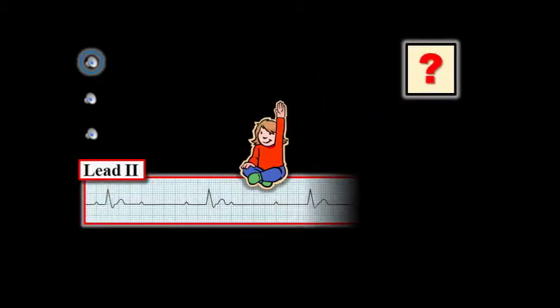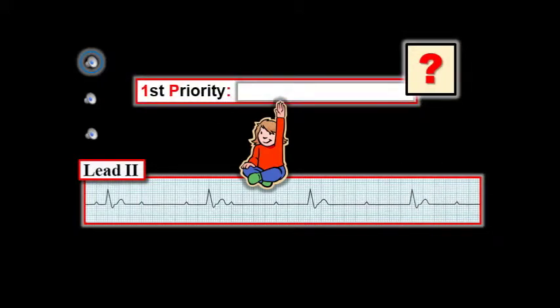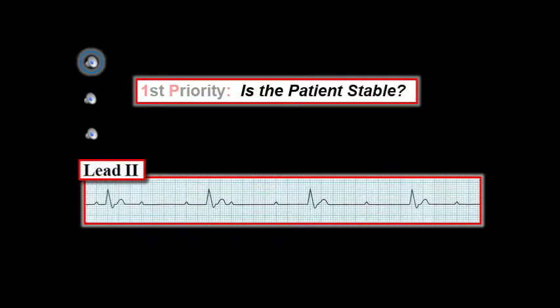So, what's happening here? Our first priority is the same thing we do first when assessing any cardiac rhythm, which is make sure that the patient is hemodynamically stable, since management priorities will clearly be different in the unstable patient. Since our focus in this video is on rhythm diagnosis, let's assume all of the rhythms that I show come from patients who are hemodynamically stable.